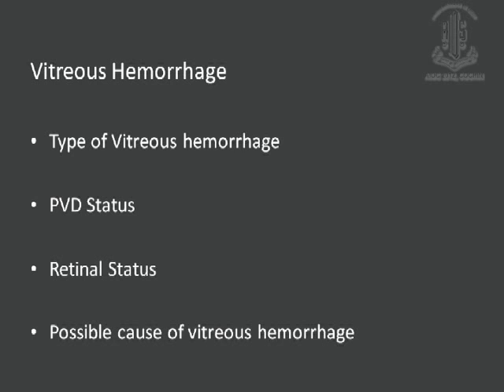what is the type of vitreous hemorrhage? We'll be seeing this in subsequent slides. What is the PVD status? This is extremely crucial for us for a number of reasons. What is the status of the retina? Obviously, this is the most important reason why we are doing the ultrasound, because if there's a retinal detachment, your management becomes surgical, management becomes immediate.